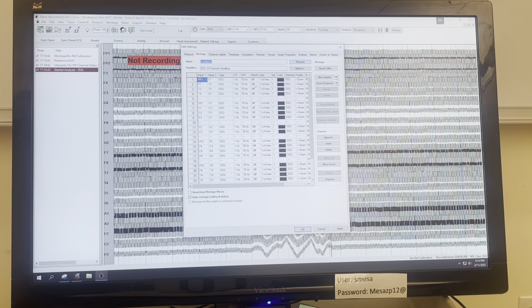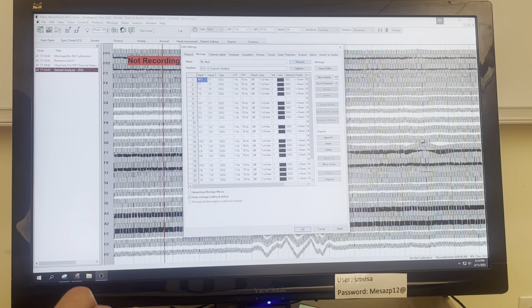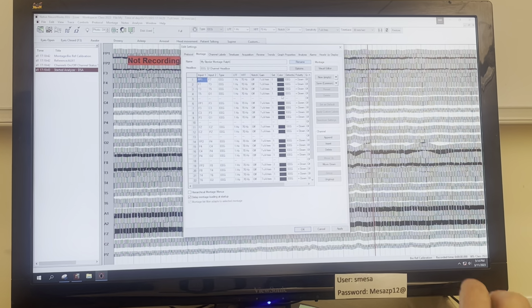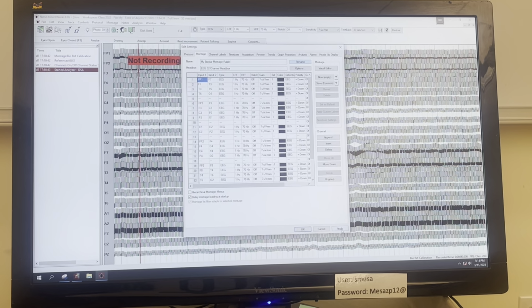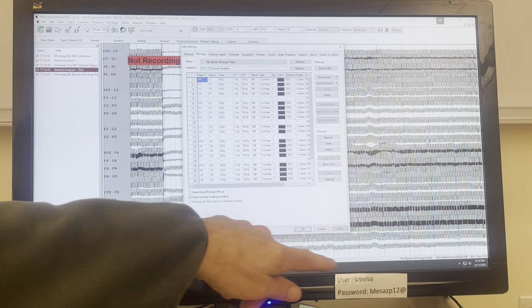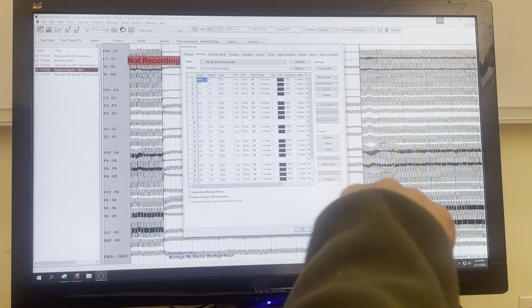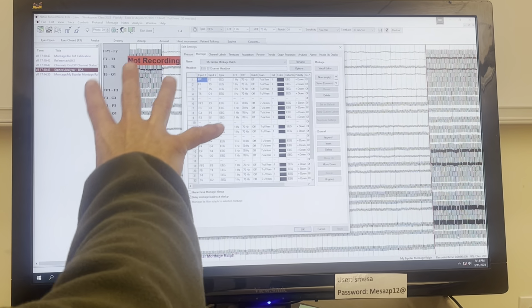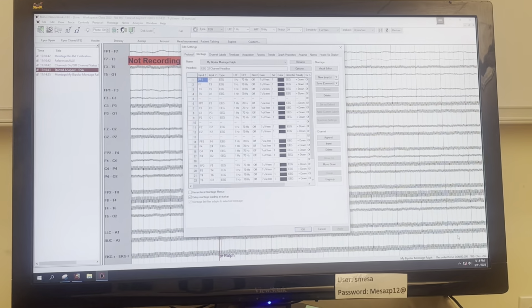And so here's your montage right here. So the next thing it wants you to do is make a title right here. So I'm just going to put my bipolar montage. You can name this anything you want. I'll put my name on there. And then you hit apply. Okay, so now after you hit apply, your montage is going to pop up right there. The montage is now on the screen. Okay. But the name changed right here. I just wanted to show you that.